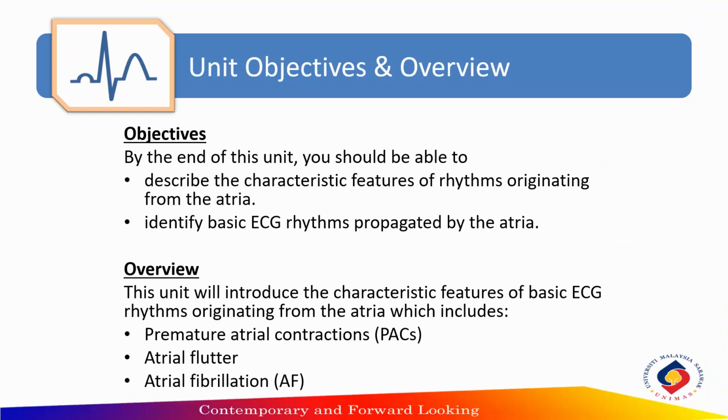In this installment of the series, we will be taking a look at rhythms which originate from the atriums of the heart, namely premature atrial contractions, or PACs in short, atrial flutter, and also atrial fibrillation.